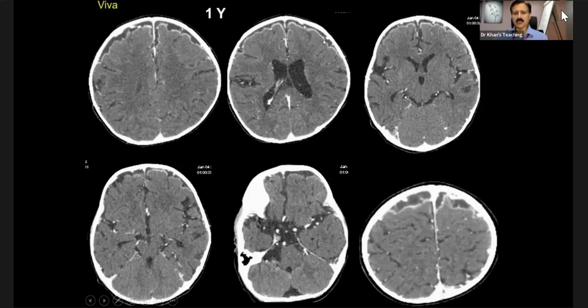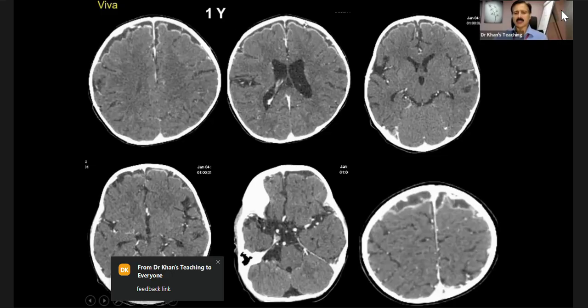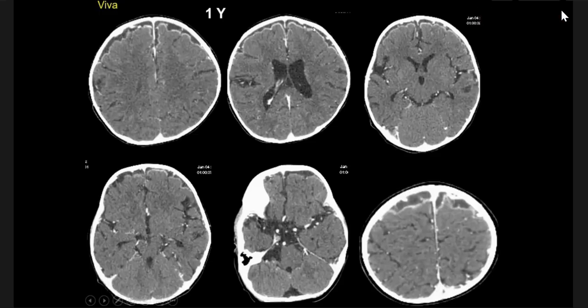If you can see that there is enhancement of the surface of the brain, what is on the surface of the brain is what we call pia mater. So leptomeninges, something which dips down the sulci, it has to be leptomeninges. But here is a space which is subarachnoid space. And if you look carefully, because we have given contrast, there is enhancement of the normal vessels.